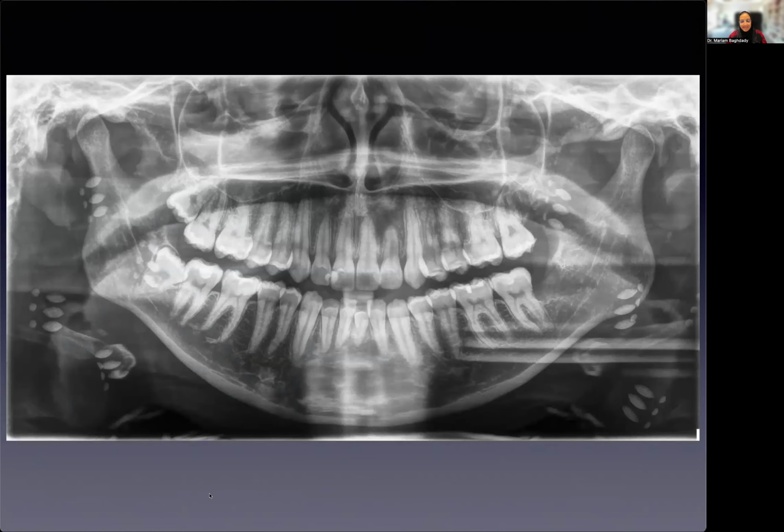Okay, this is a fun one. This is a fun error. And I think it's only here.